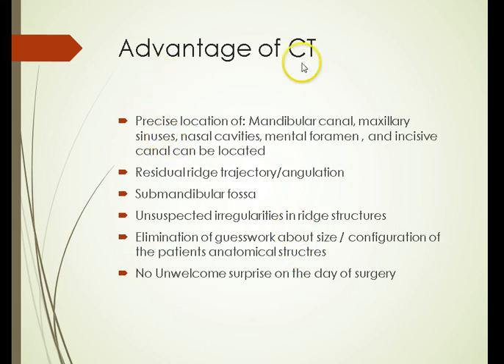So continuing with the advantage of CT, precise location of the mandibular canal. So not just that you can have a good visual, but you have the exact precise location of the mandibular canal, the maxillary sinus and its floor, the nasal cavity, the mental foramen, the incisive canal, the nasopalatine canal can be located. The ridge, the trajectory, the angulation, because now you're looking at it in a 3D image.